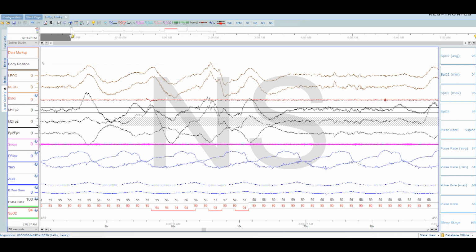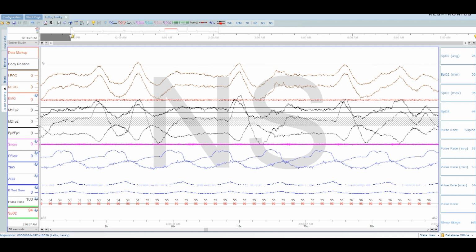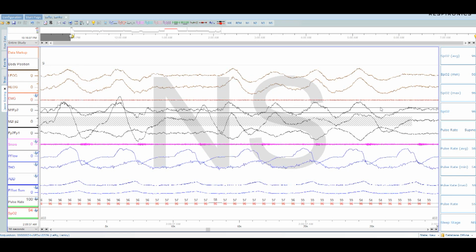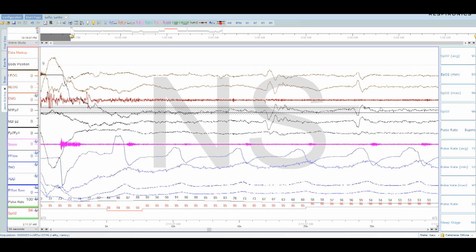We'll go over this exact same thing with the respiratory, all of the respiratory channels. So this is just staging. This is probably really not that helpful. I just kind of wanted to do a video of this stuff because I never do staging.